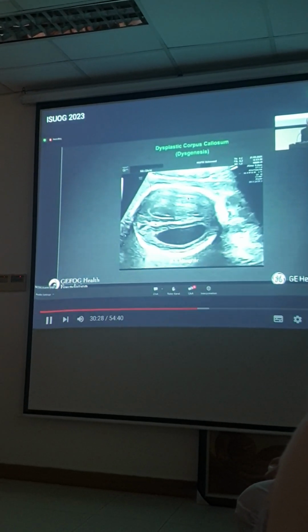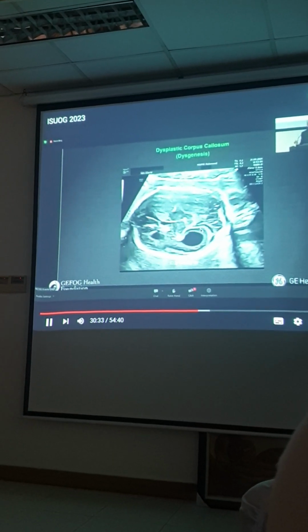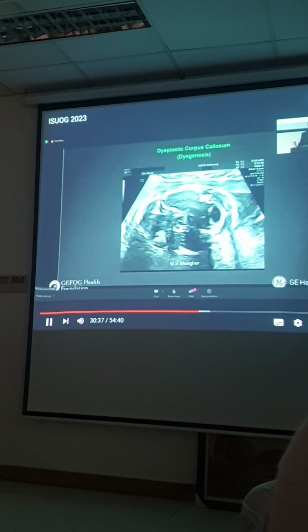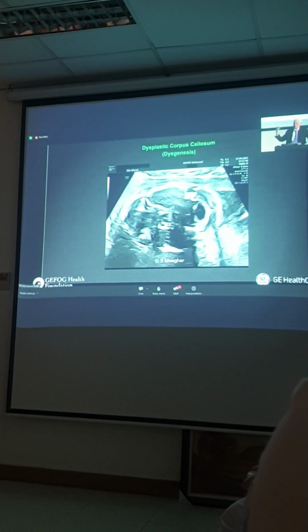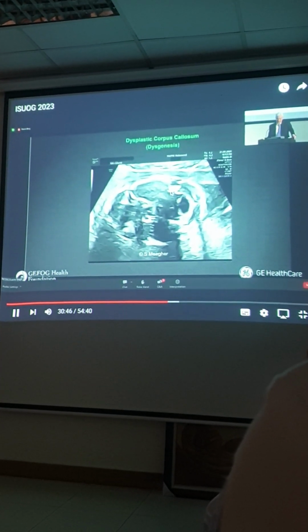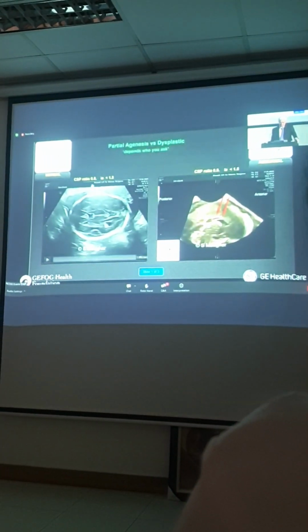You also know there is no Sylvian fissure. The fetus also has an enlargement of the posterior cranial fossa, a midline ventricular cyst. And once you see that combination of findings in the fetus who also had echogenic kidneys, it brings you to the ciliopathies, which I'll be talking about in detail in my very last talk on the kidneys and see that combination of brain and kidney findings. The ACC is part of the findings that you'll see with the ciliopathies.